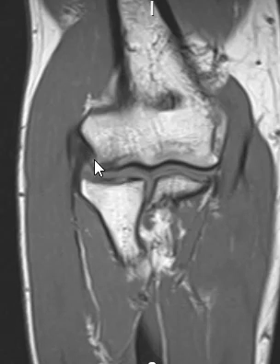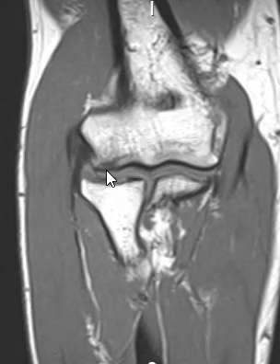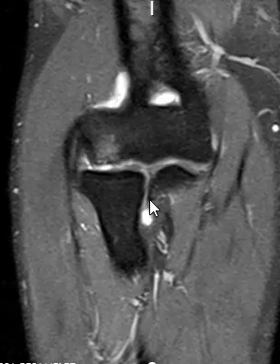Now here we have the capitellar articular surface of the humerus, and we notice here that you have dark signal beneath the articular surface, either marrow edema or sclerosis or a combination in the subchondral region of the capitellum. So we did a fat-sat PD image here, and we see that there is a small defect and some marrow edema. And here it is.